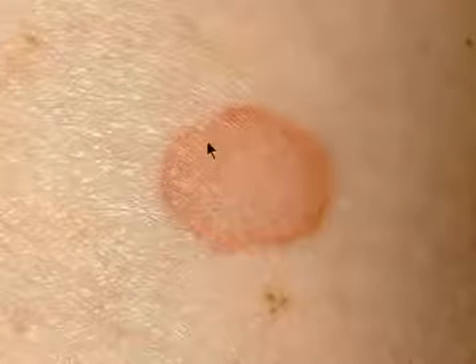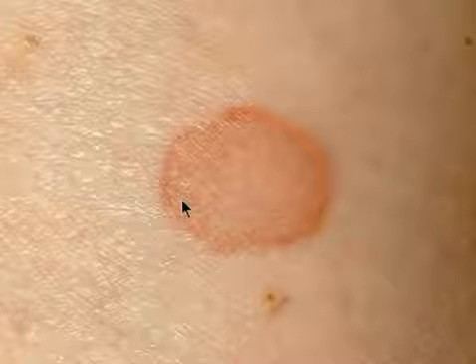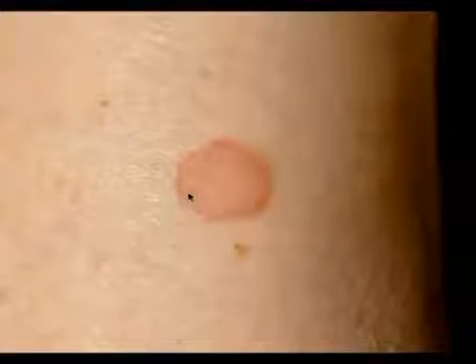Another example here, unpigmented lesion, slightly elevated. Clinically you can see a peripheral rim, and you may already suspect the diagnosis of porokeratosis. How does it look dermoscopically? One pattern, dotted vessels only. Well, there are some linear vessels here, but you can disregard that. The main pattern here is dotted vessels, and we also see a peripheral rim. This is the porokeratotic rim that is so typical for porokeratosis. So the diagnosis here is porokeratosis.